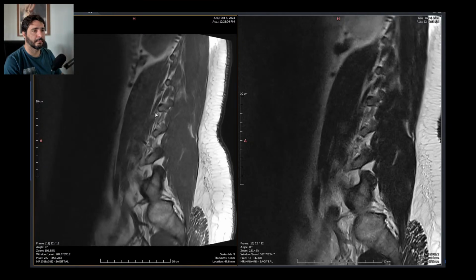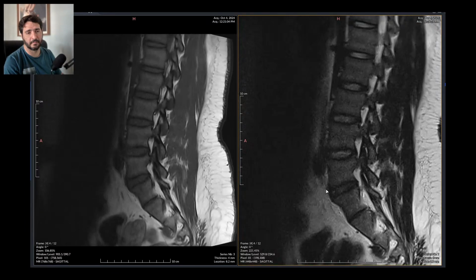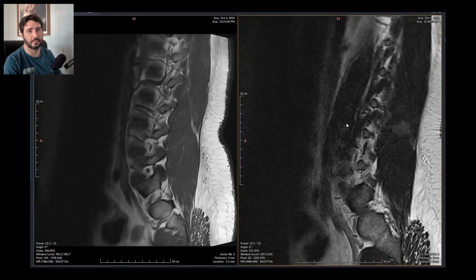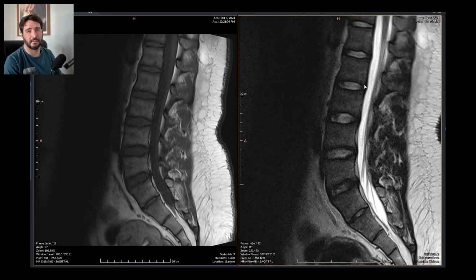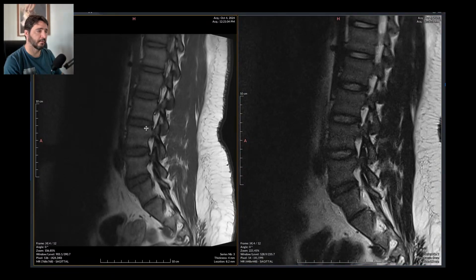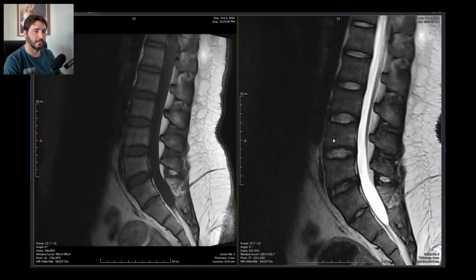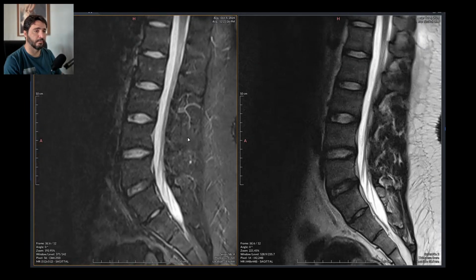Oh man. Okay. I don't know if this is a transitional vertebra, because I can't really tell. They made too few slices on the sagittal scans because reasons. And it's all noisy and shaky. Of course, why not? So I'm going to say this is proper S1, and anything else from here up is lumbar spine. Can't really tell. It's not properly done. I could just curse, send this back, but I'm going to report it anyway because it won't report itself.